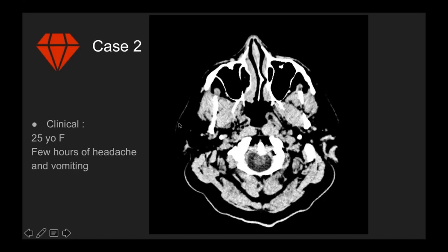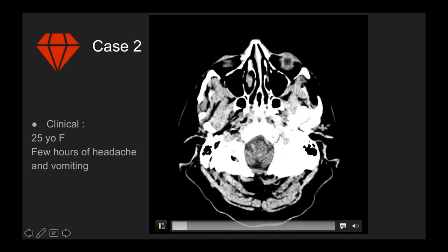So we're on to case 2 now. The first case was fairly simple, just to ease us into it. Case 2, we are looking now at a 25-year-old female, and she's presented with a few hours of headache and vomiting. So here we go, we'll look at this video again.